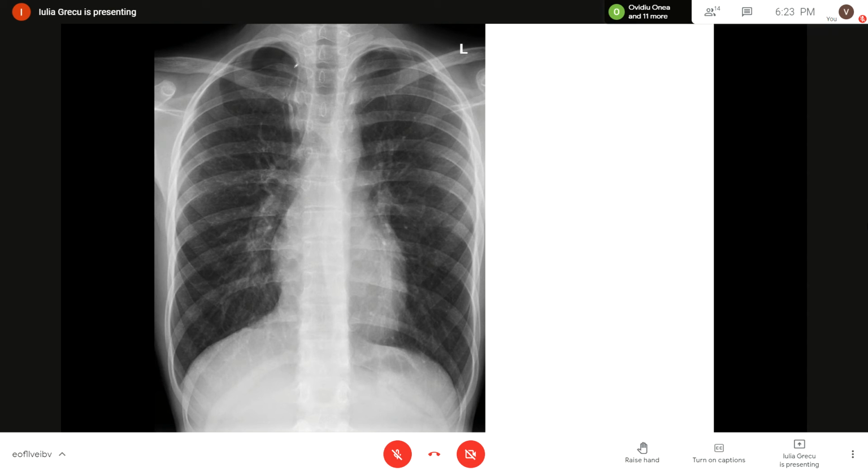That firstly, it accumulates in the most superior parts of the thoracic cavity because of gravity. It is a hyperlucency compared to the normal lung because it has no vascular structures over it, and it is sharply delimited by this thin bright line that represents the visceral pleura.